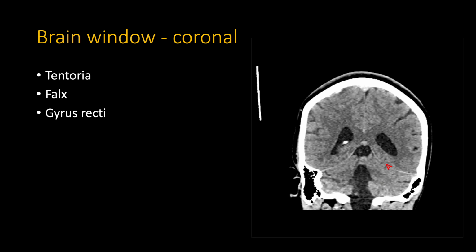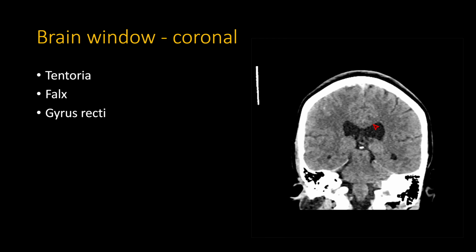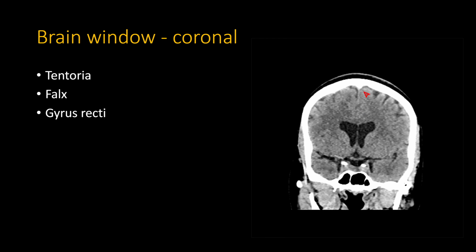And if you see one of them asymmetrically dense or asymmetrically thick compared to the other side, that will be a clue that there's a subdural hematoma. You see the falx very nicely as far as looking for subdurals, falcine subdural hematomas right here. And again, you get many looks at the falx, so you can see that there's no thickening, asymmetric density, etc.